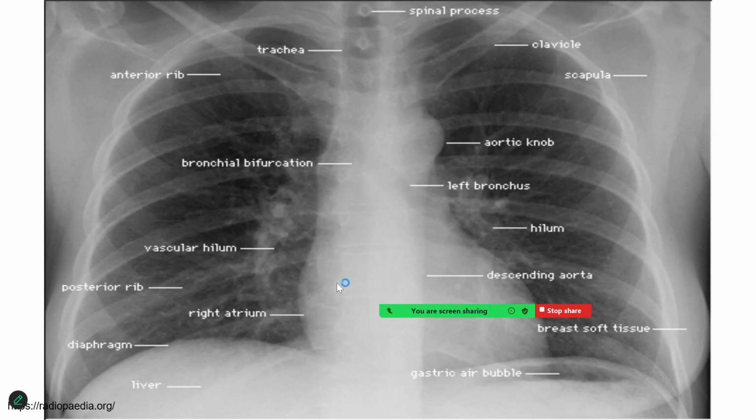Then, of course, the cardiac shadow, the precordium, constitutes the major area of the chest X-ray, where the heart as a whole, the periphery of the heart would be seen, and the aortic knuckle also forms the midline.